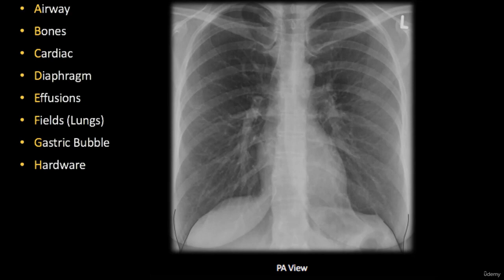Sometimes we can see a level of fluid in this costodiaphragmatic recess, and we call it effusion because we don't know what exactly this fluid is. We're going to make the next step then and aspirate some fluid out for biochemical examination to make the precise diagnosis and to figure out whether it is blood or pus or lymph or just interstitial fluid. So normally the angles are empty.